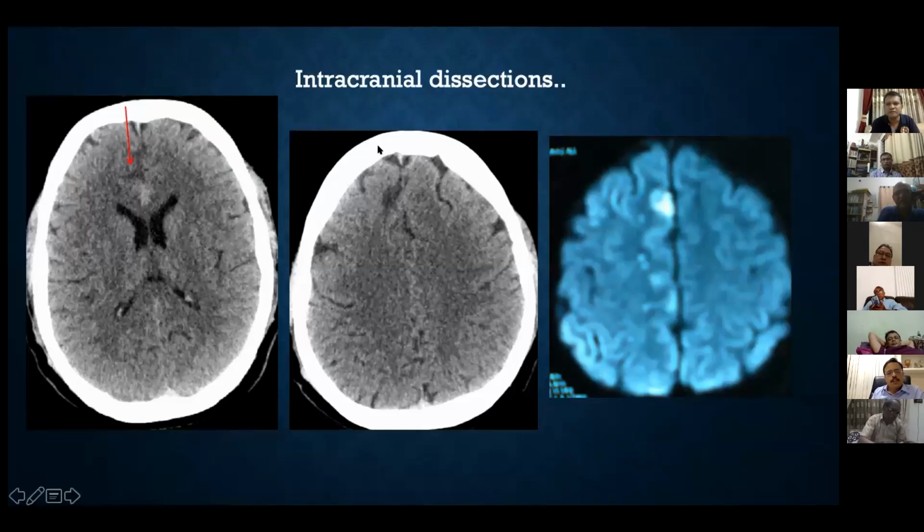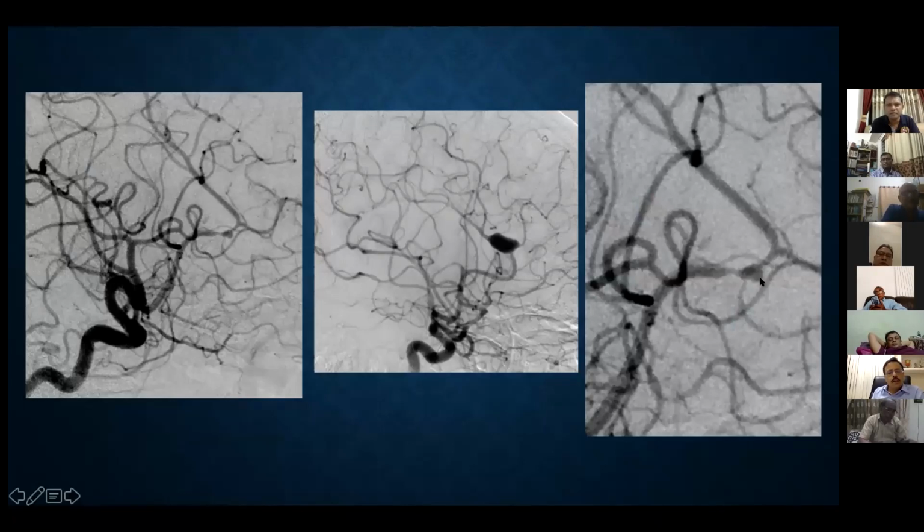This is another patient with right-sided ischemic symptoms. But when you do a DSA, what we realize is that there's a classical dissection. There's a narrowed artery, then dilated. So this was a dissection with a small aneurysm formation in this patient. And interestingly, even on the opposite side, the opposite cerebral artery was also dissected with a fusiform aneurysm. So you have to realize a lot of intracranial dissecting aneurysms can initially present with ischemia, but later on may develop big aneurysms and may cause bleeding as well.